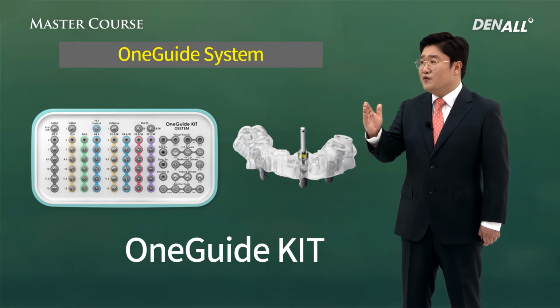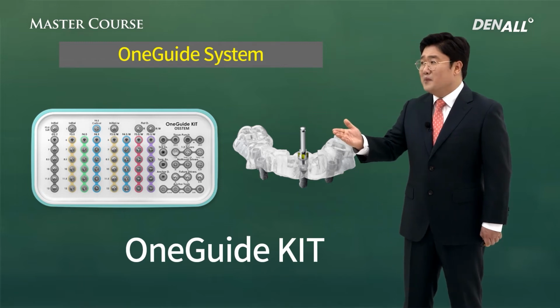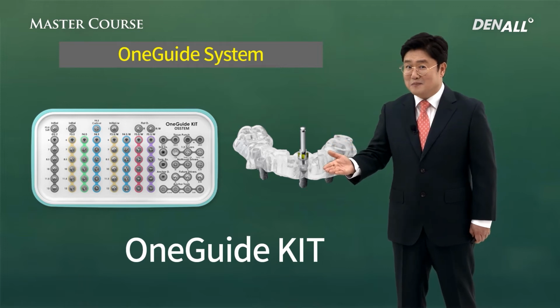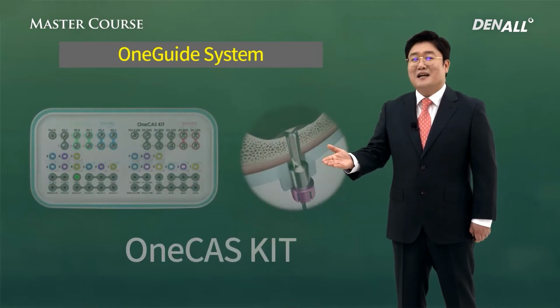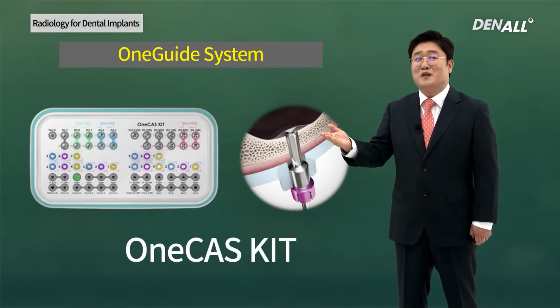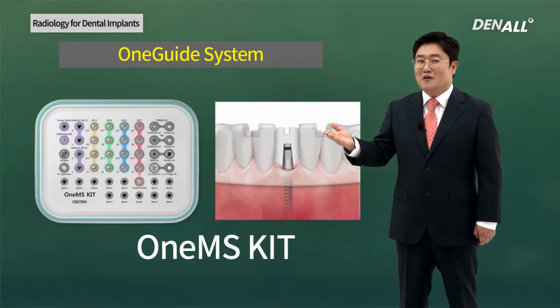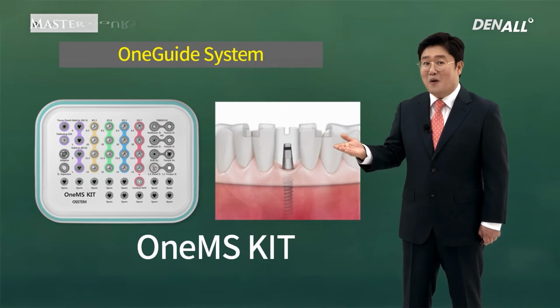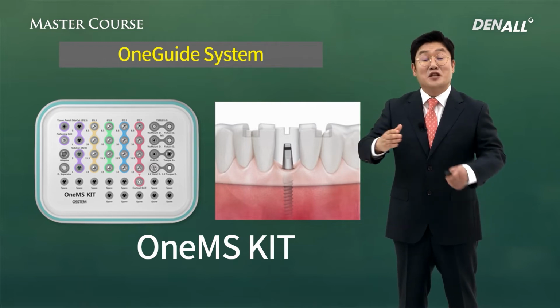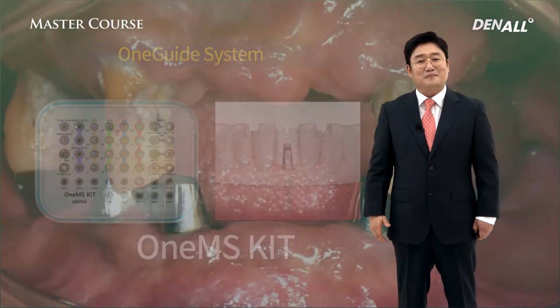After the virtual planning, digitally guided surgery can be done using this one guide kit. It is already prepared. For sinus lift surgery, one CAS kit is absolutely necessary, and for placing thin implant, one MS kit is ready. So all those three kits are available, and those three kits will be integrated into one guide system.